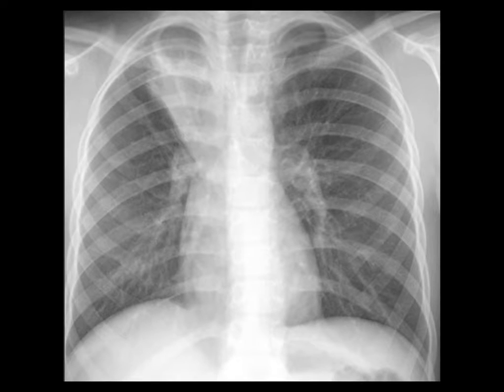So here is a child who has right upper lobe atelectasis. Let's look here at the hilar. See? Here's the right hilar, here's the left. The right is slightly higher than the left. That tells us it's been elevated. So this here, which might have been misread as being an area of right upper lobe pneumonia, is in fact right upper lobe atelectasis. And this here is the elevated minor or horizontal fissure.